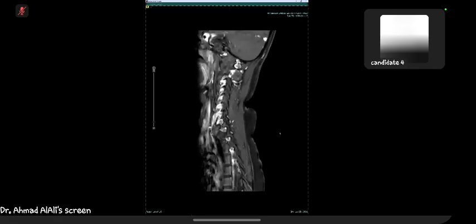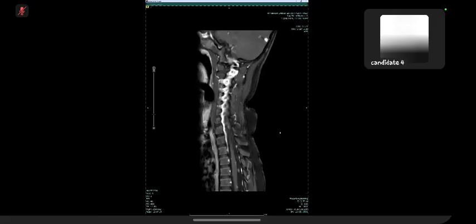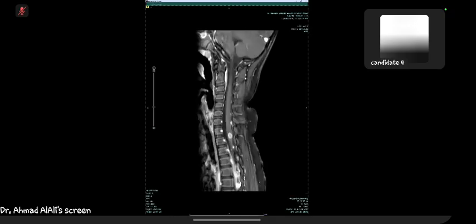I am trying to look at the leptomeninges to see if there is any nodularity or enhancement. I can see that there is nodularity and enhancement of the leptomeninges along the cord. These lesions, both intramedullary and leptomeningeal, point towards metastatic disease spread. For a young patient, I would be thinking predominantly of intracranial tumors, which could result in CSF seeding. These could be pineal lesions.